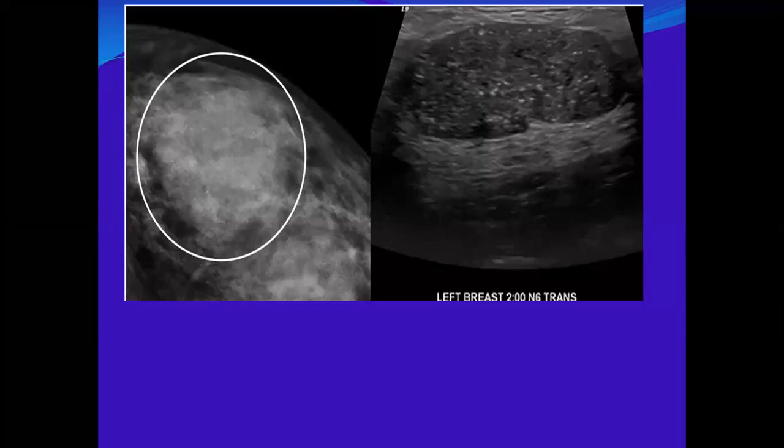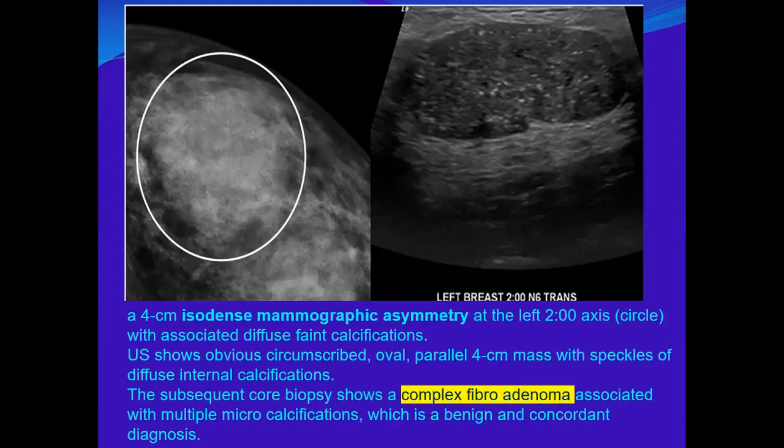Yes, you are right. Do you know fibroadenoma? Which type of fibroadenoma? Not atypical one. Specific name, specific characters of fibroadenoma. If it contains cystic changes and microcalcification, we call it complex fibroadenoma. Okay. So ultrasound shows circumscribed.